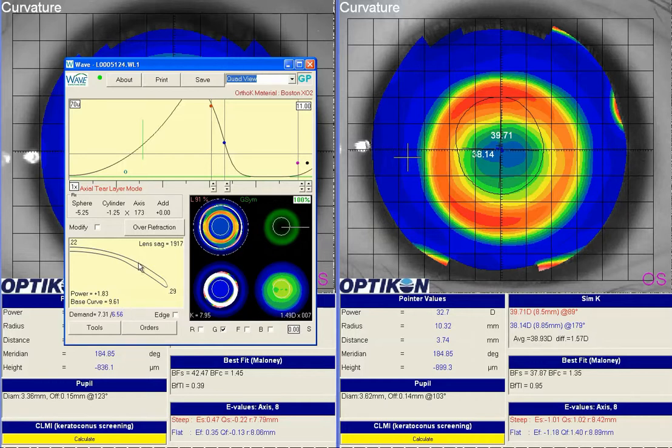If the treatment zone size is an issue in terms of glare and halos, then we can try to do some things to adjust it. But with this corneal profile, I think no matter what we do, the patient's just going to have a small treatment zone. There's just some anatomy going on that we aren't going to be able to circumvent 100%. If this is a younger patient and the complaint is more just residual myopia, then I would just address that and leave everything as it is.